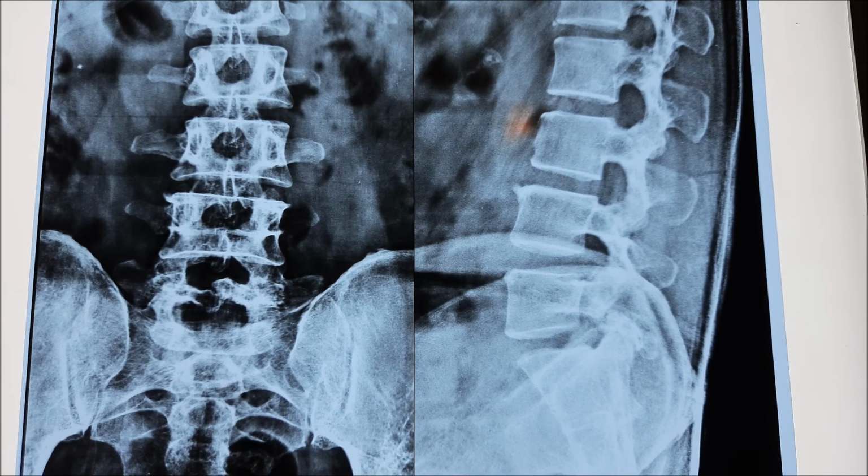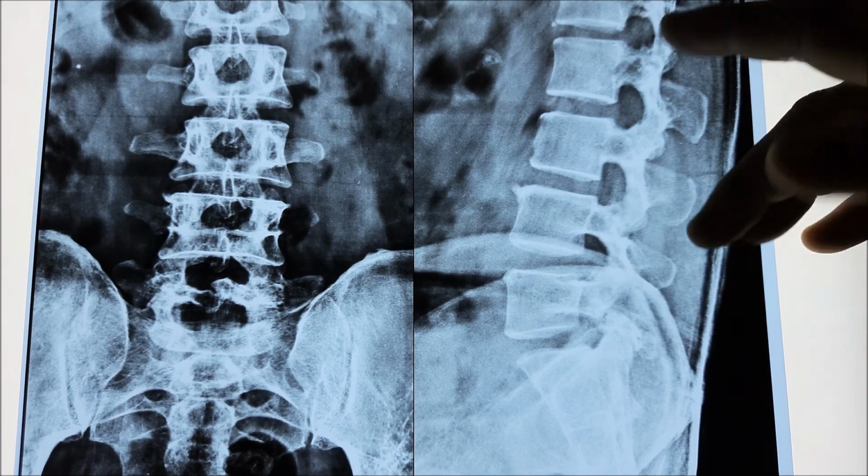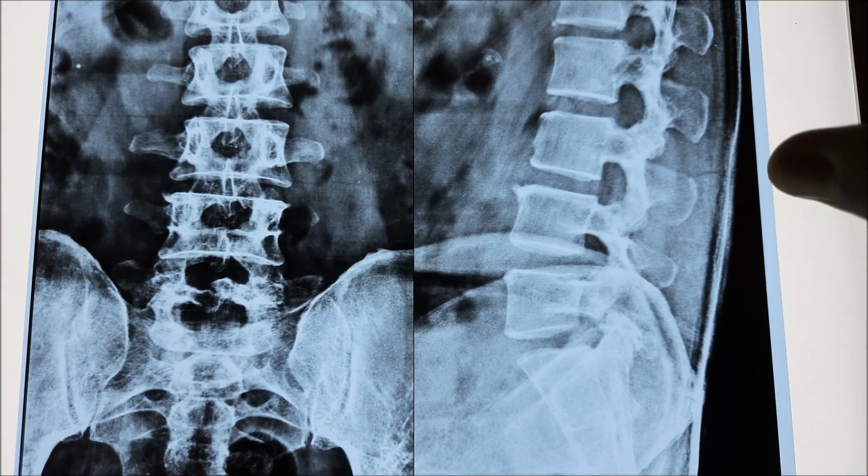So today we discussed with you traumatic spinal injury and the views of traumatic spinal injury. A few of the times whenever a patient comes to us, sometimes we forget to do an X-ray, and without doing an X-ray we assess the patient. These types of findings are very easy to neglect, and that may result in long-term complications, because there might be compression of the cauda equina, and that can bring a lot of neurological complications. That's what is important about this particular radiological view.